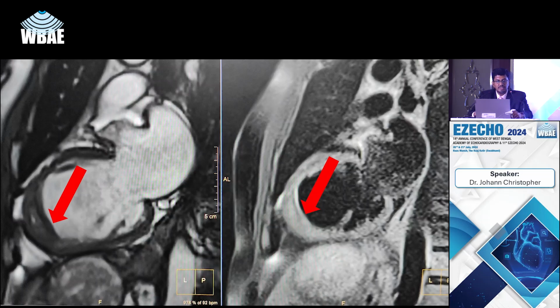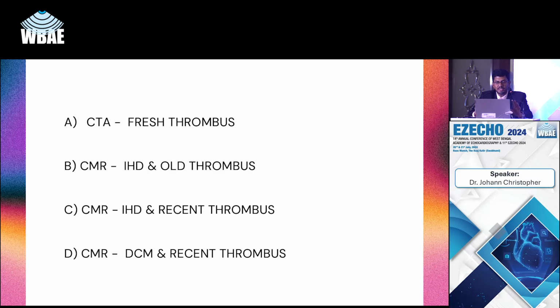Question 15 is a 72-year-old gentleman with worsening shortness of breath and chest pain, elderly person, and he's come to you with chest pain and breathlessness. So again, the pictures would be similar to what you would see in a parasternal long axis on the echo. So nothing different. We're not asking you for any specific MR pathology, but just like you would see it on the echo. I think it's pretty self-explanatory, but watch the image closely. Same view of a parasternal long axis on echo. These are MR images, they are only cine images. So very similar.